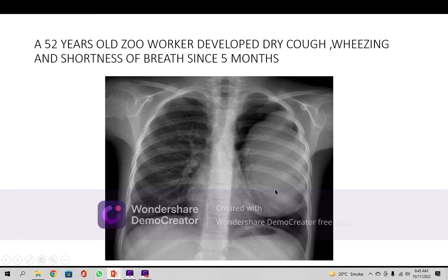Tuberculosis can present as any opacity, remember, so tuberculosis should be excluded. Although tuberculosis will not form this type of opacity, a cavitation full of exudate, it's possible because this part has an air bronchogram. So it should be excluded, although it is not the main diagnosis. Fungal infection can cause a big opacity, but it should be multiple opacities rather than a single opacity. As far as allergic reaction is concerned, extrinsic allergic alveolitis will not present like that.